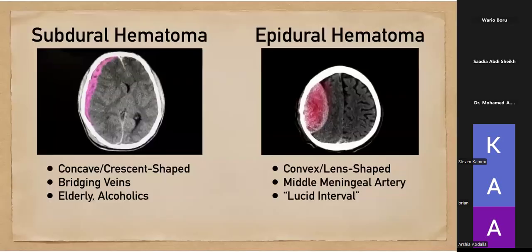Next, after the bone, you come to below the bone. So below the bone and above the dura. Remember, the meninges are 3. There is dura mater, arachnoid mater, and pia mater. So below the bone, but above the dura, we call it an epidural hematoma, as an example. So here you'd see it would have this appearance.